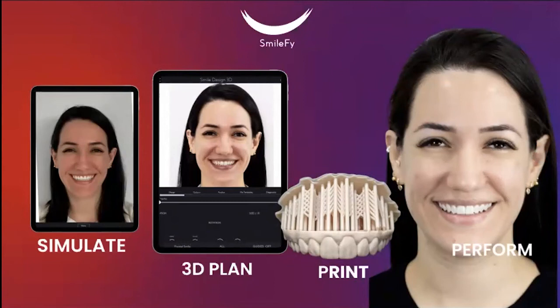This is the type of workflow that we have here on SmileFy, which is to help you simulate smiles, which is a very quick, fast solution using AI technology, to then 3D design your cases by uploading the patient's files, calibrating them, selecting the best teeth design, 3D printing, and performing the mock-up trials.